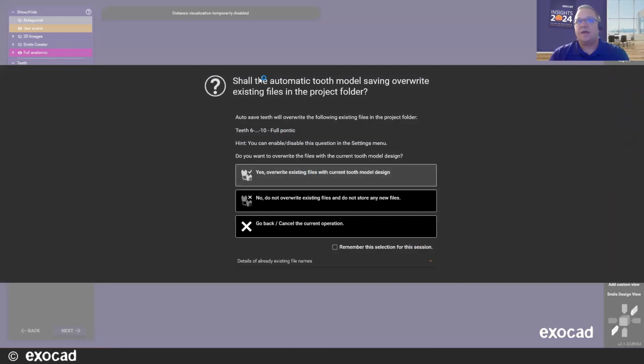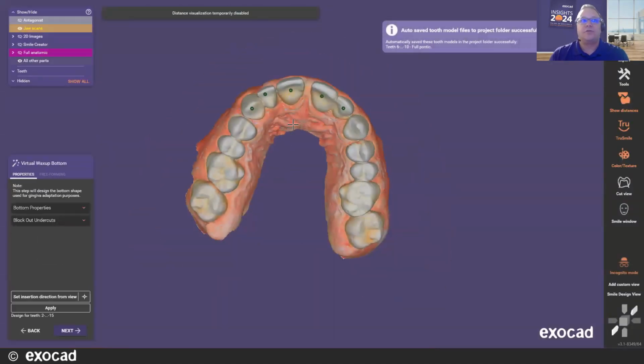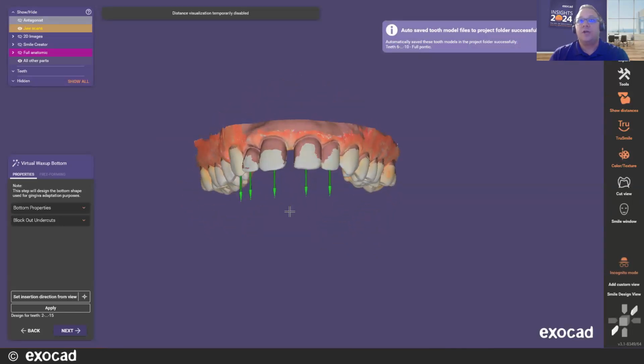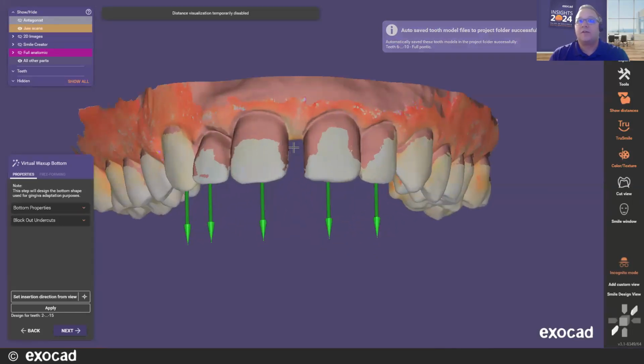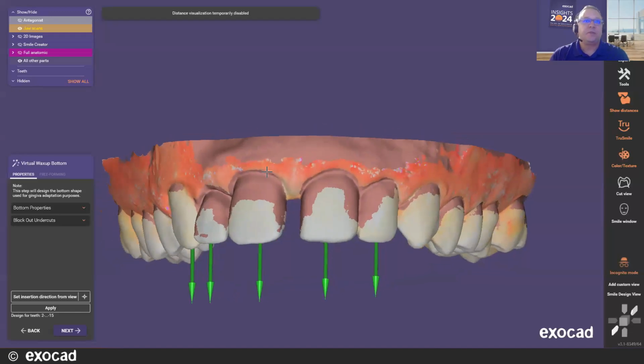And once again, the premise of this is once the patient's prepped, these files are saved in the project folder. So the 3D files, and then you'll have the ability to change in the DentalDB the restorative option. And when you reopen that case, the software will recognize it. You can load that design in and you don't have to redesign.